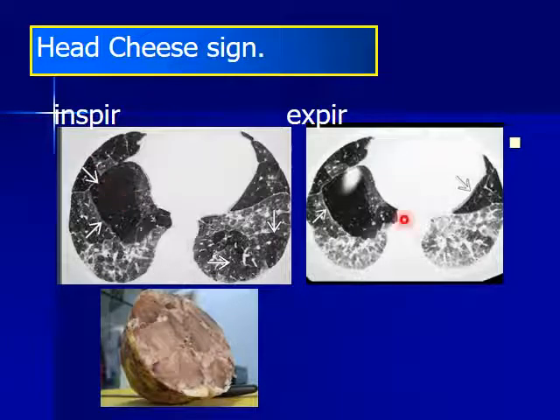Look for this patient. Look for this area of air trapping. It is blackish like this. And this area contains ground glass. If we go to do expiratory film, please compare. The area of air trapping doesn't collapse during expiration.